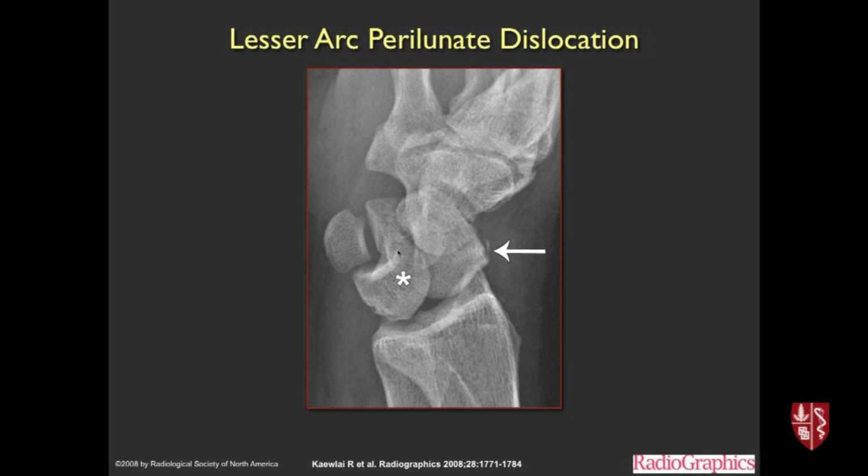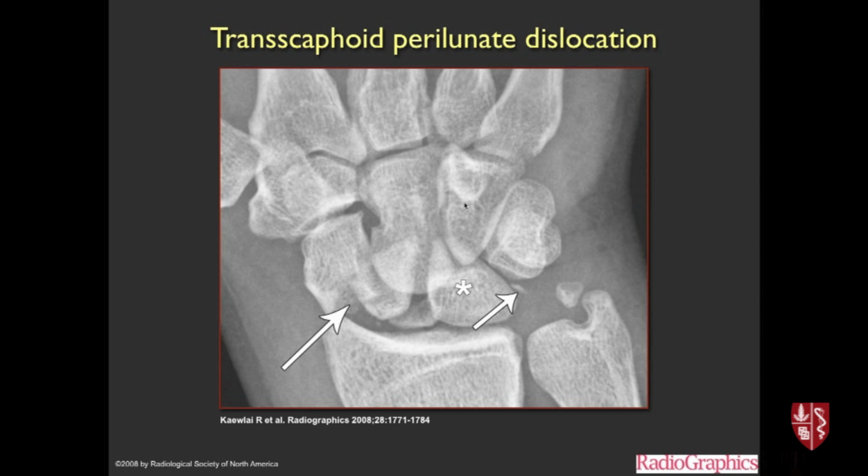The more final stage of that is called a lunate dislocation, where the lunate is completely dislocated from the carpal bones, and there are different subtleties about whether the distal row is dorsal or palmar or not. But basically, you should just be able to identify whether there's a carpal malalignment pattern. Here's another one that you should be able to identify pretty easily, or at least identify that it's abnormal.